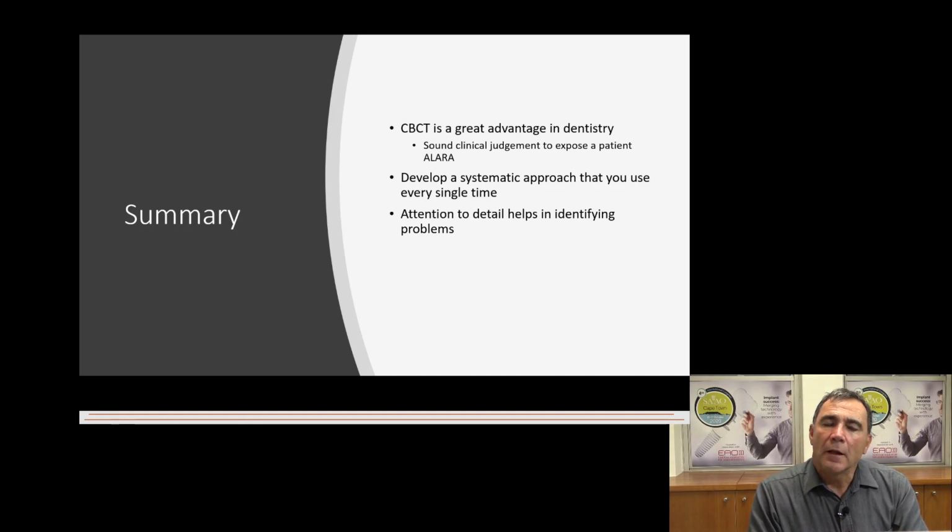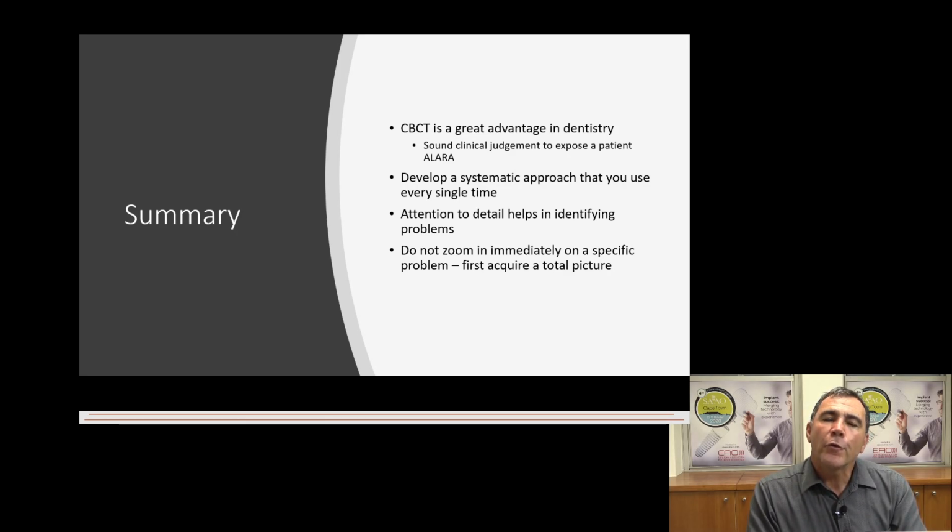Attention to detail helps in identifying problems. Do not zoom in immediately on a specific problem. First acquire a total picture, and from there you zoom in closer, zoom in more, until you have found and identified all of your problems.